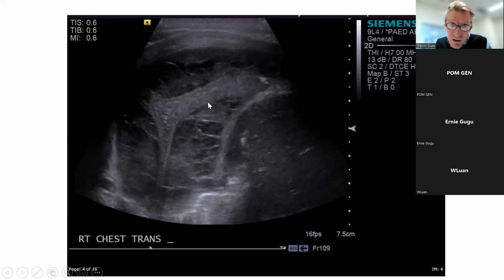All right. Now, those of you who are used to looking at effusions on ultrasound might notice something here, and that is that this part here is the lung, right? This part here, but this all around is an effusion. So this area here, this is lung, this small wedge-shaped opacity there, and this is fluid all around it.